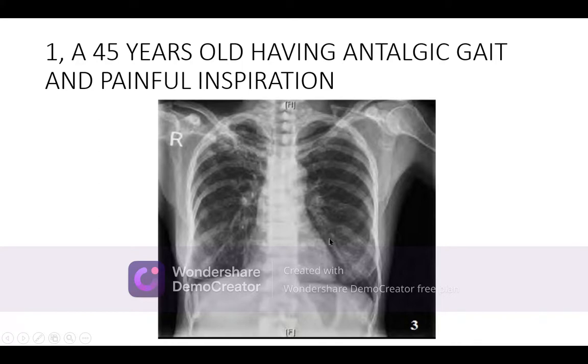Otherwise, clinically, the patient has been osteoporotic or osteomalacic or has adynamic bone disease or secondaries in the bone, etc. But so you will do the other parts. The pelvic bones should be visualized to confirm the Looser zones, which are very, very commonly seen there. And Looser zones occur because the blood supply is crossing over the bone.